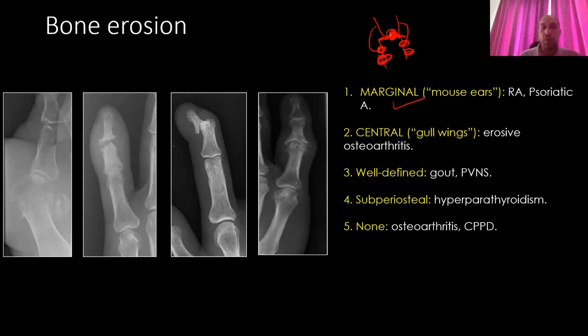Okay, so there are central erosions here. Okay, there is central erosion, and there is some whiskering and bulging. And here there is marginal erosion, but it is not central erosion.